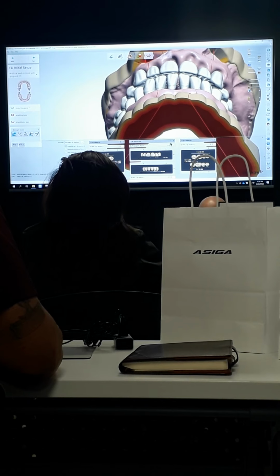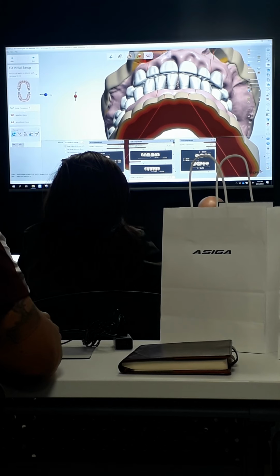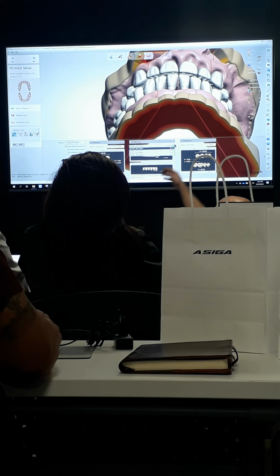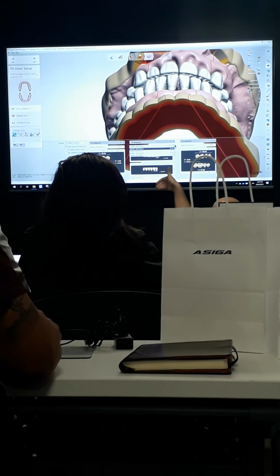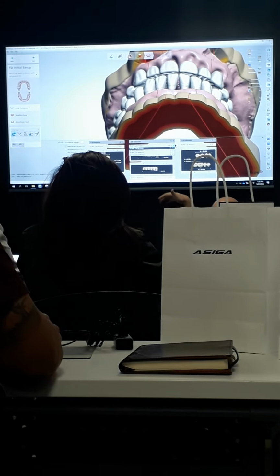Now, if you're looking for a different type of occlusal scheme, the gray box here, you can hit the arrows there, and you can typically find lingualized, balanced. I'm not sure if they have any other classes or not. But you can see as I scroll through, it's giving me the mold shape and what type it is, if it's lingualized or balanced. And then when I drop down the upper anterior box, all of the molds within that particular library are available there below.